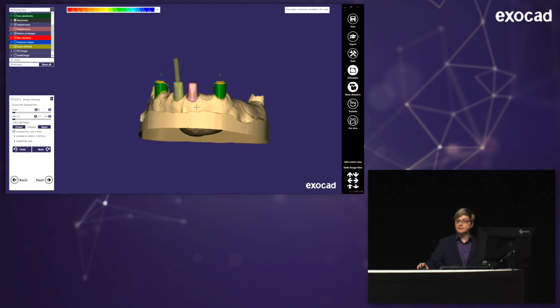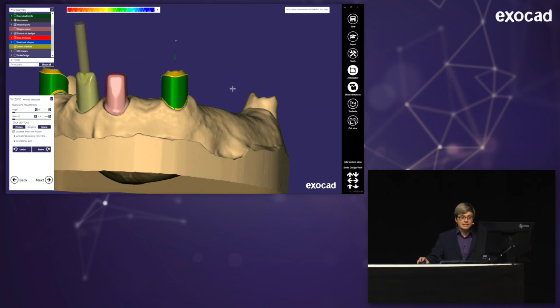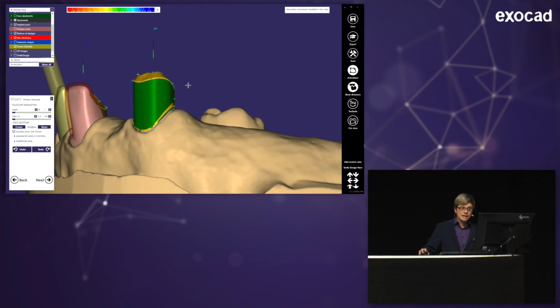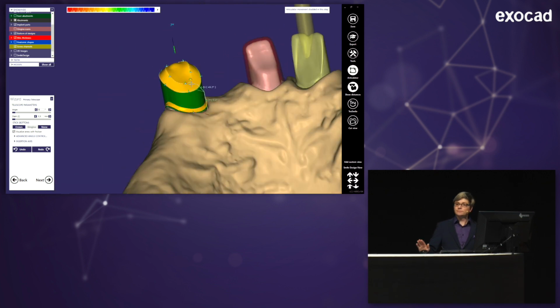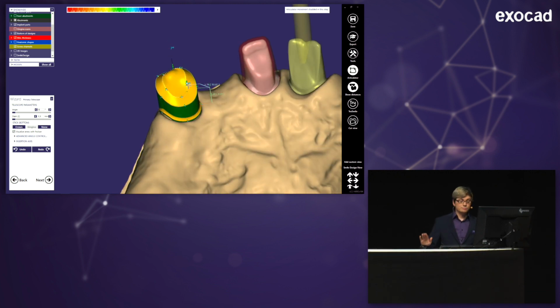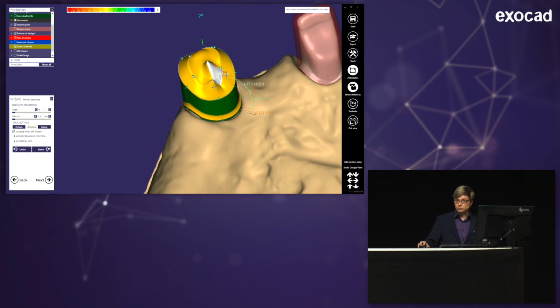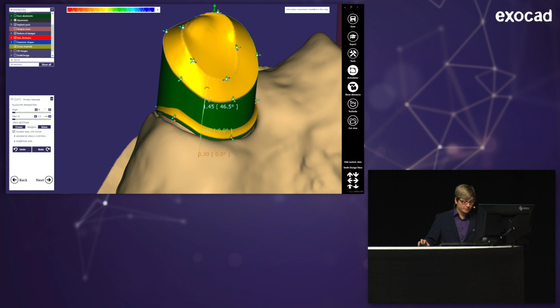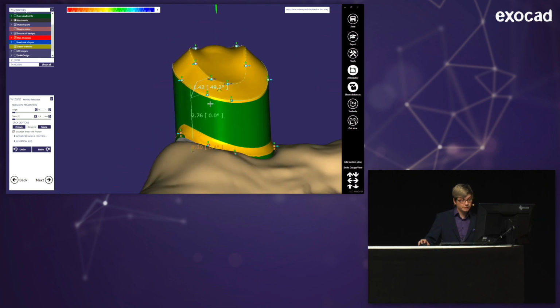So now I'm designing the telescopes. And this step, in my eyes, is the most interesting about this whole project. Because designing milled linguals is not that easy at first glance. You don't really just find it yourself. It seems a bit more complicated. It's actually not that hard to do, but you wouldn't find it yourself. We have a video of that on our YouTube channel, actually.